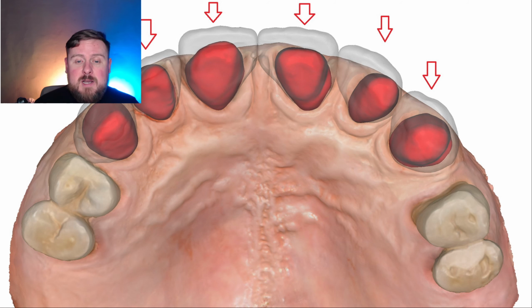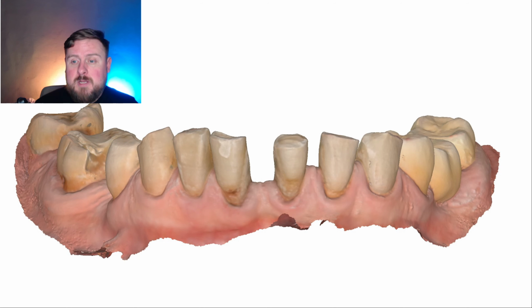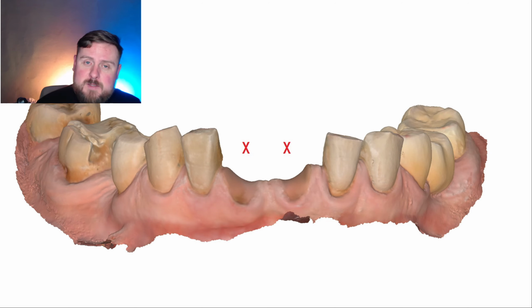And there is guidance written that you can remove around 2.5 millimeters in the upper crown third next to the incisal edge on the centrals. Just please follow the text and do as it says here. You can remove these teeth and position the lower centrals as you like, because the surgeon has already removed the teeth. That's amazing, eh? It makes your job much easier.